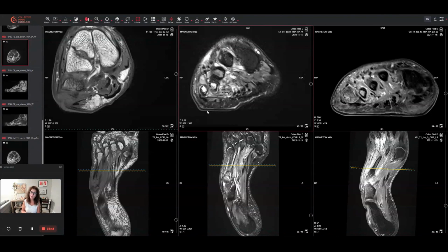We can have cellulitis, a different reason to have infection, where there's actually infection cells there, and you can deliver contrast and see the cellulitis enhance. And of course, with contrast, you can also see an area that doesn't enhance, where you have tissue necrosis. So in fact, you can see bland edema related to diabetic vasculopathy. You can see cellulitis related to infection, and you can see non-enhancement, which may be related to a necrotizing infection or ischemic tissue.